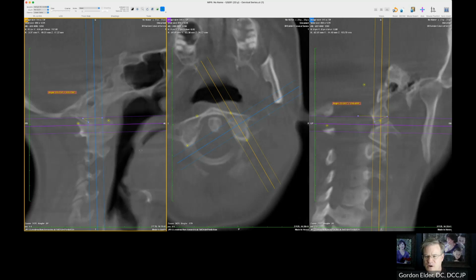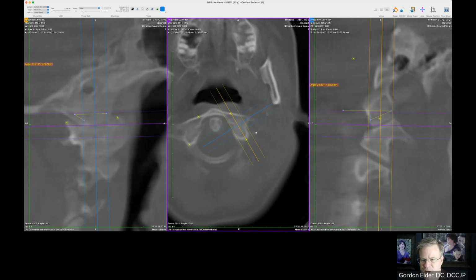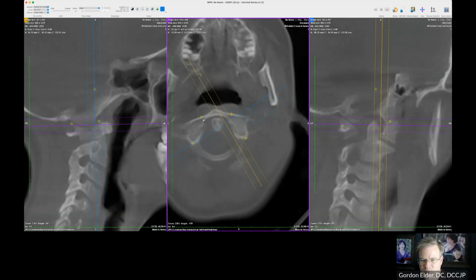I'm sure Dr. Blair didn't do it because he would have had to take another x-ray at 90 degrees to the convergence angle to get that pure slope line, when he could do the adjustment, and it works really well without having it. So again, we're needing a ballpark figure, but we can actually do a little bit better than that. So all right, I take a screenshot, I write it down. Now I'm going to come over here.